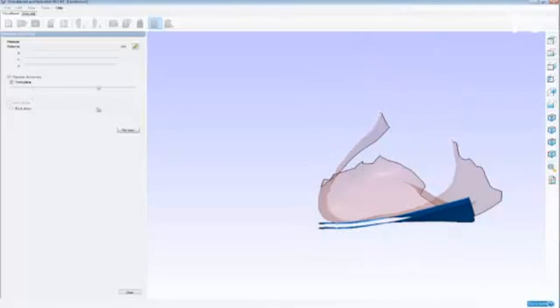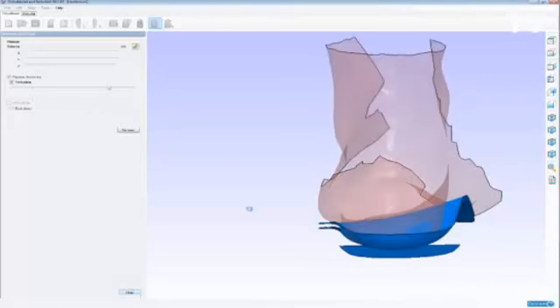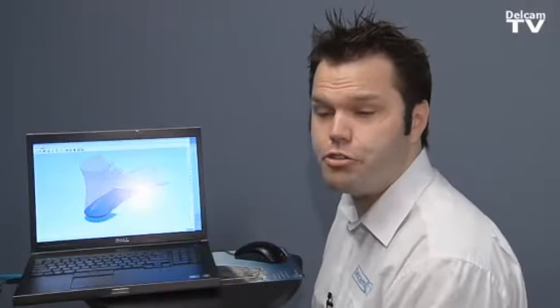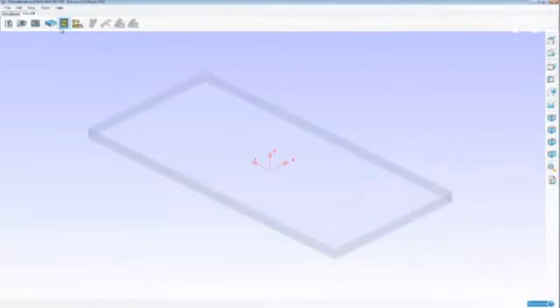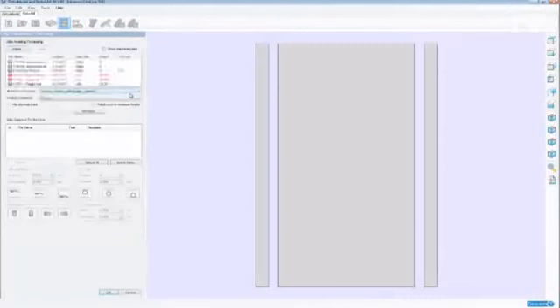Once we have finished designing the orthotic and we're happy with the design, we can then move on to OrthoMill to prepare for manufacturing. I'm able to select the material that I'm going to use to cut the orthotics and also the sizes as well. So I'm going to select one of the blocks that I have on my library. Then I'm going to select an orthotic so I can place on the block. And as you can see, OrthoModel tells me that some orthotics are not going to fit on a 1-inch block. I may need to select a thicker block. The last orthotic that I have designed fits the block because it's not as big as 1 inch.